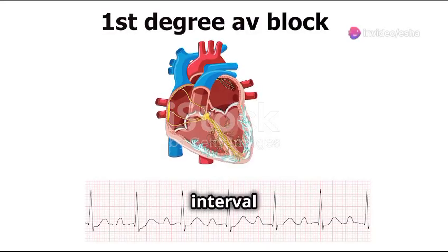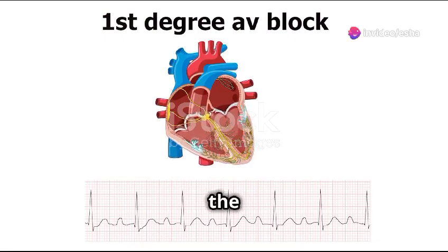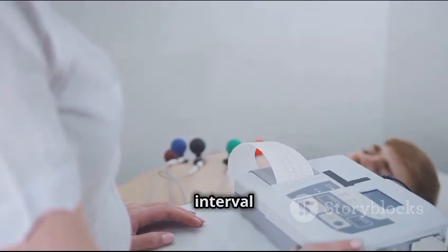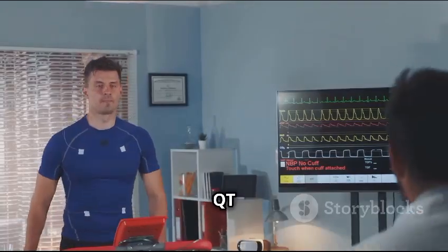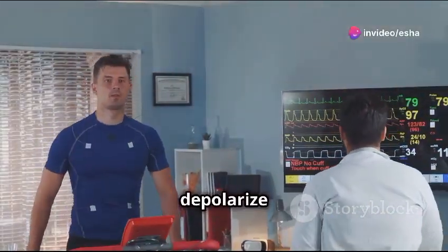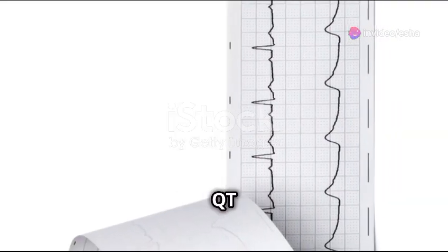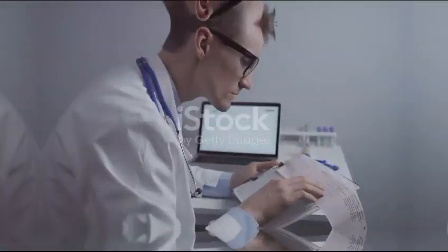The PR interval represents the time it takes for the electrical impulse to travel from the atria to the ventricles. A prolonged PR interval could indicate a heart block. The QT interval represents the total time for the ventricles to depolarize and repolarize. A prolonged QT interval can increase the risk of life-threatening arrhythmias.